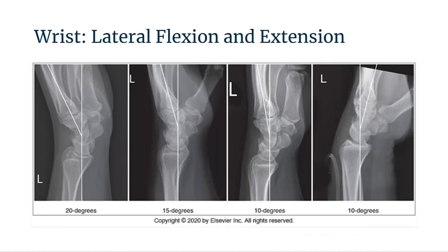If you recall the image analysis guidelines, they state that the second through the fifth metacarpals are to be placed at a 10 to 15 degree angle with the anterior plane of the wrist. And this imaging here is just to show you how flexion and extension can obscure anatomy. When there's any flexion and extension, then the trapezium will be demonstrated with superimposition, and it changes the position of the pisiform and distal scaphoid's relationship. So it is important to make sure you're within that 10 to 15 degree angle with the anterior plane of the wrist to show the anatomy appropriately.